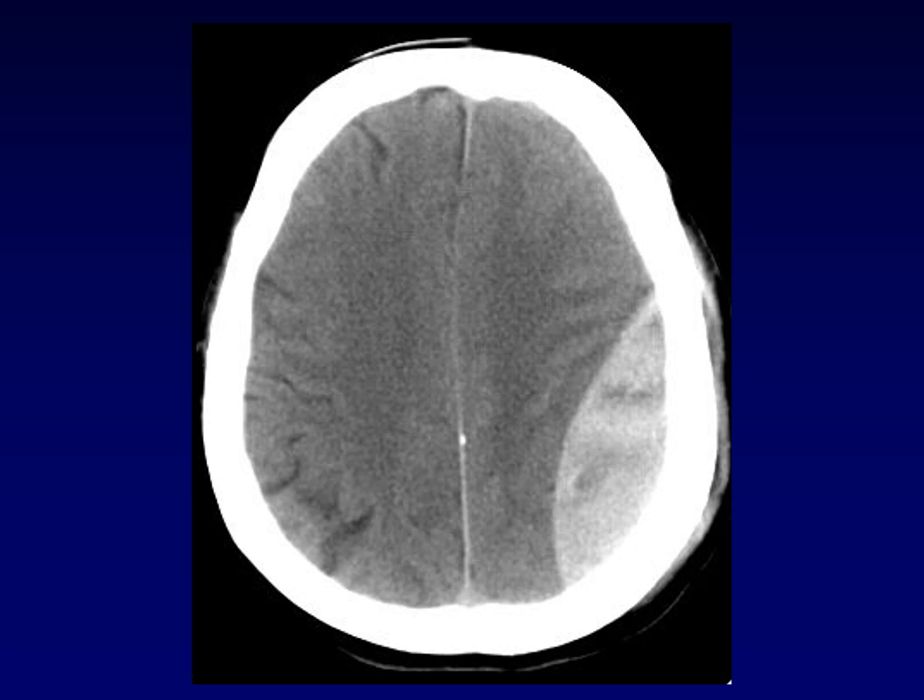Here is a clot. And you can see that the clotted blood is much denser than the normal brain. Not as dense as the skull, but much denser than brain. So we're going to try and figure out where this clot is, and the way we're going to do that is we're going to use the configuration of the hemorrhage. Notice that this hemorrhage creates a convex surface against the inner surface of the skull, but it also creates a convex surface pushing hard against the brain.